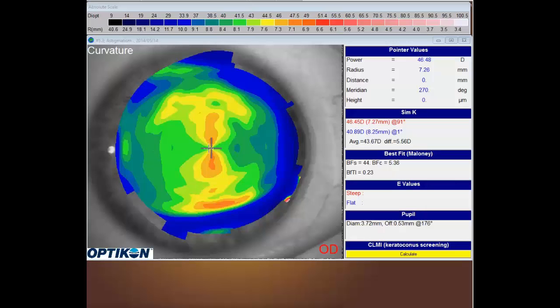First of all, you want to think about the shape of the cornea. So if we look at our topography, first of all, you want to think about whether the cornea is symmetric or not, or if it's irregular. So this is a pretty symmetrical cornea. Do you have irregular areas? Do you have areas of severe elevation or big flattened areas? Is the image centered or decentered? This one is rather well centered. Is there astigmatism, and if so, is it more centrally located or is it more limbus to limbus? You also want to think about which meridian is the steepest and which is the flattest.